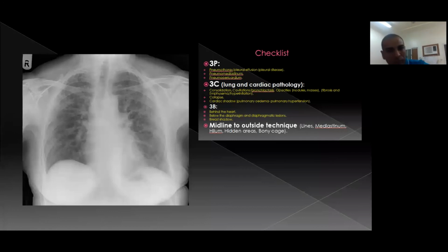Yes, Doctor. Again, Dr. Habib. Go on. Just wait a minute, let me see the picture again. I think most likely there is a left-sided hilar mass. This hilum is branching, like this one. I was sleeping at that time when you discussed it.